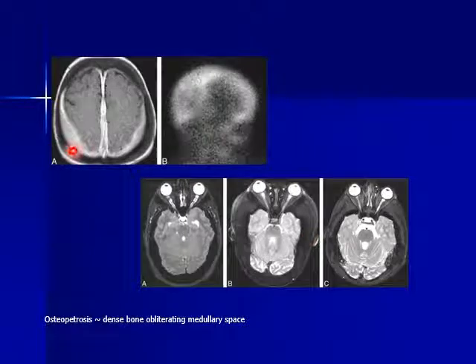Another example, as you see, as if we have dural masses like this, okay, and the patient shows signs of chronic anemia and hemosiderin deposition, widening of the diploic space, hemosiderin deposition, very low signal here, and on sulfur colloid, as I've told you, technetium, there is uptake of the radioactive material by these tissues.